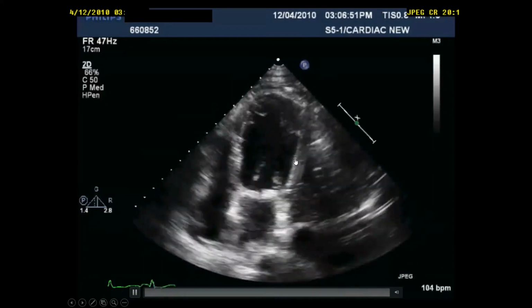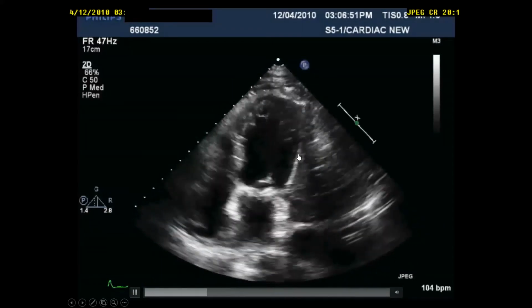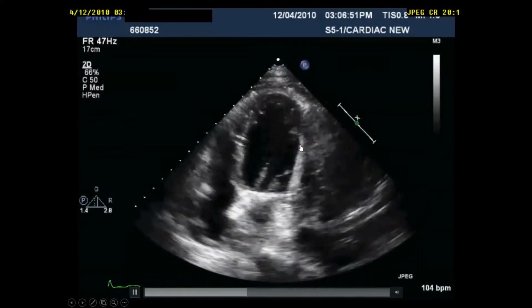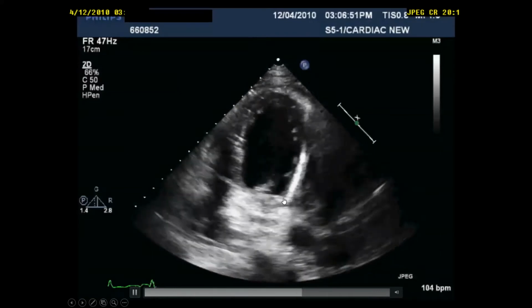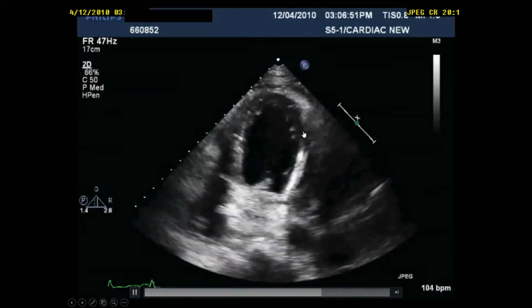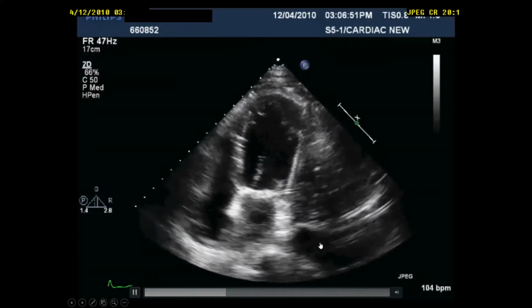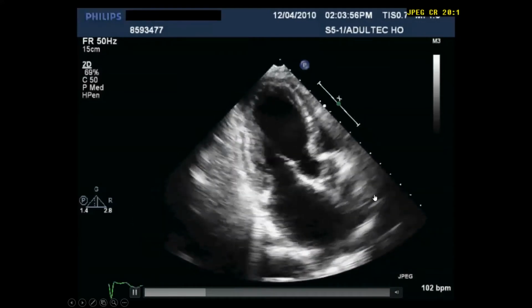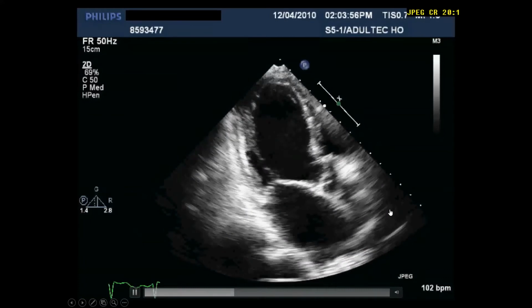The lateral wall shows no contractility, and in fact, it shows ecodensity. And again, this is scarring of the lateral wall. So this is akinetic lateral wall with evidence of scarring. Okay? So this is how you describe this image. Now, anybody can take this.